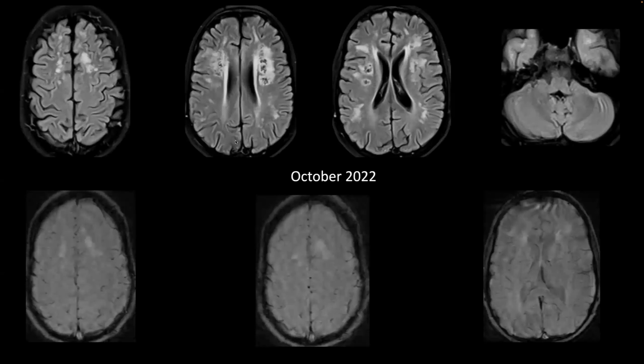And then a follow-up scan in October 22, that is after 2 months, and you can see that the lesions are slightly more confluent in nature. The white matter changes have extended now into the parietal lobes and the temporal lobes. You can appreciate that the previous lesions are now demonstrating cavitatory changes and gliosis over there. I don't have the diffusion sequences, but there were no areas of restricted diffusion on the diffusion or ADC sequences. No hemosiderin or calcifications on the SWI sequences.